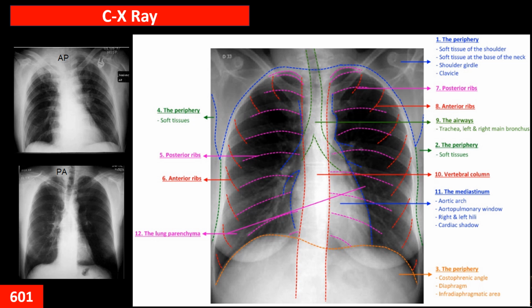As you can see here, the classic chest X-ray is PA, or posterior anterior. The chest of the patient is toward the plate of the film, and the X-ray tube is posterior to the chest. And we can see those structures very easily: shadow of the heart, trachea, and costodiaphragmatic or costophrenic angle, and those ribs and structures, and pulmonary artery, and bronchus.